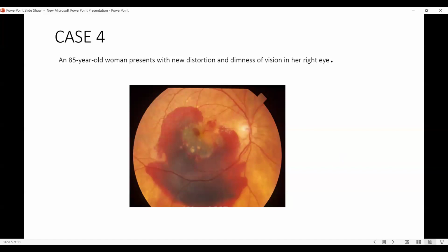Okay. Any other sign present there? The veins are tortuous. No, I mean any prominent sign, like are drusen there? Yes, yellow white spots, especially in the macula. Okay, then what is your diagnosis? Choroidal neovascular membrane secondary to age-related macular degeneration in the right eye.